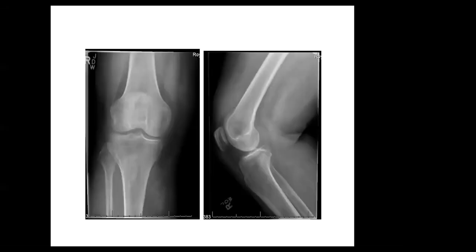So remember I said no. If you allow me, regarding the patella, it's normal. Patella is normal. Okay, so remember, I said no calcification. All right, because this is important.